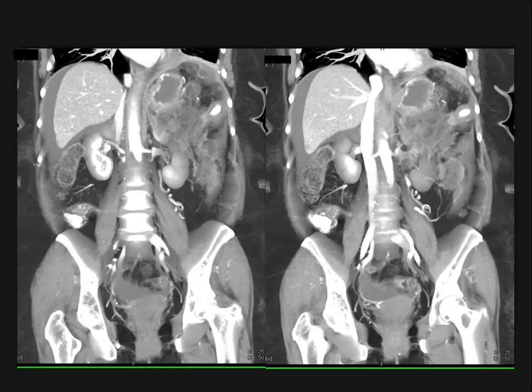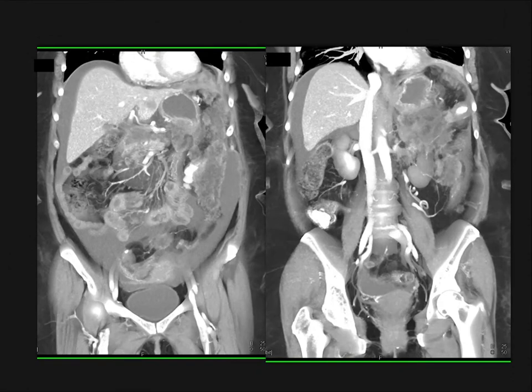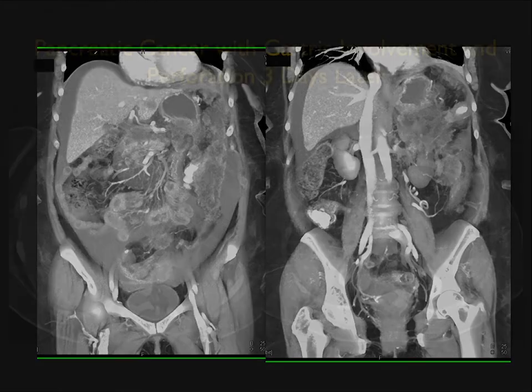So you can see again the pathways of tumor spread become critical. I do mention the presence of ascites becomes typical for malignant spread of tumor. If you have underlying cirrhosis, that may not be the case because maybe a baseline is low of ascites. You might need to tap it, but typically, when I see lots of ascites, unless there's liver failure or congestive heart failure, it's going to be malignant, as in this case, there's carcinomatosis present.